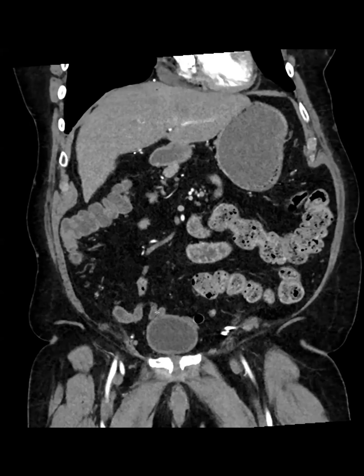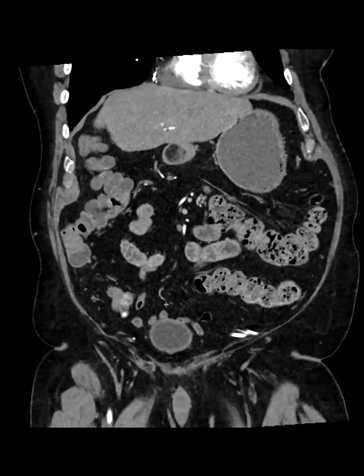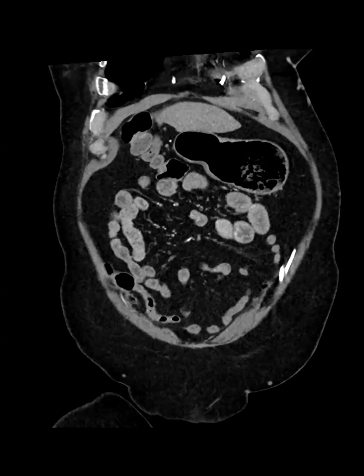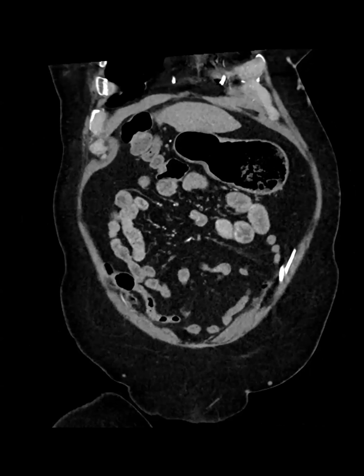Sorry, there was a question about the TI. What was the comment? Should I reshare that? The TI didn't really impress me, but let me make sure that we cleared the TI. What was the comment about the TI? Okay, never mind. Maybe it just looks a little full. Maybe they were wondering if that was the abnormality. Oh, gotcha. Yeah, no, I thought the TI was fine.